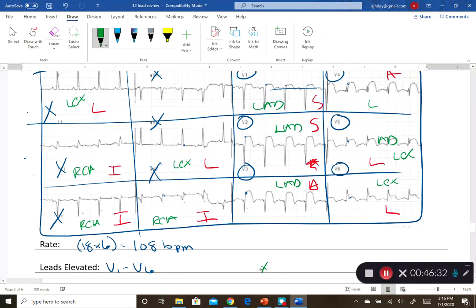All right, so let's go ahead and label this. It looks like I can see it really well in lead 1: a narrow QRS complex, a normal P wave, a normal PR interval, so it is sinus, but it is going to be sinus tach, because I'm over 100 beats per minute. And this is going to be that big long one, because I got 3 walls affected now, so I can write anterolateral septal STEMI.